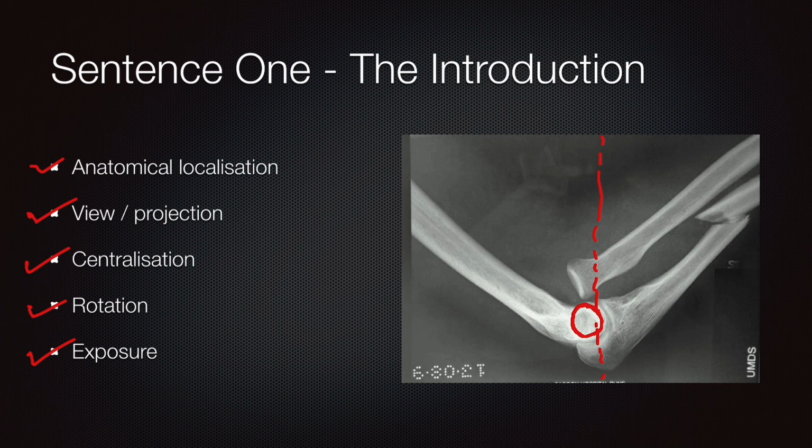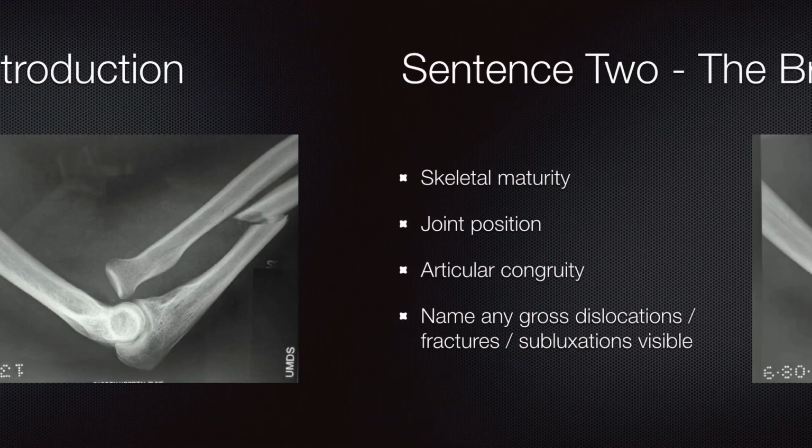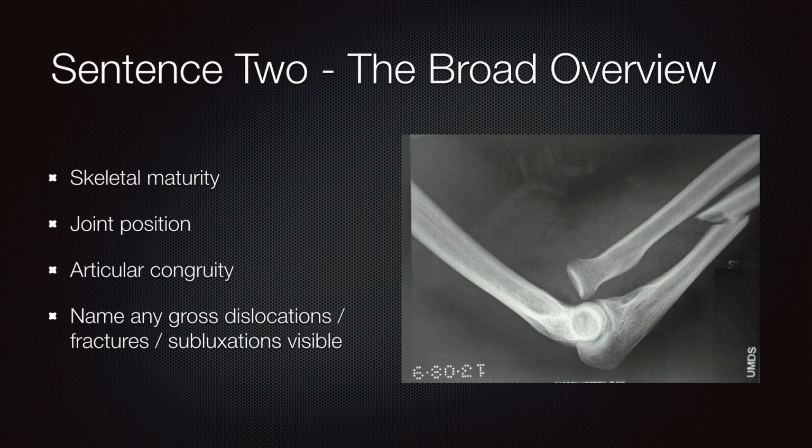This was your first sentence of your X-ray. Moving on, let us take a look at the second sentence, which provides a broad overview of the bones that you're looking at. So you can make a comment on the skeletal maturity.